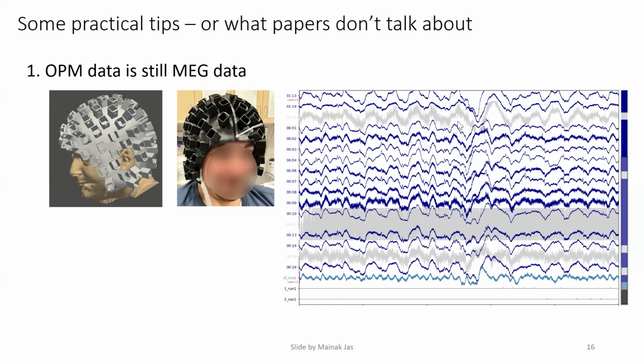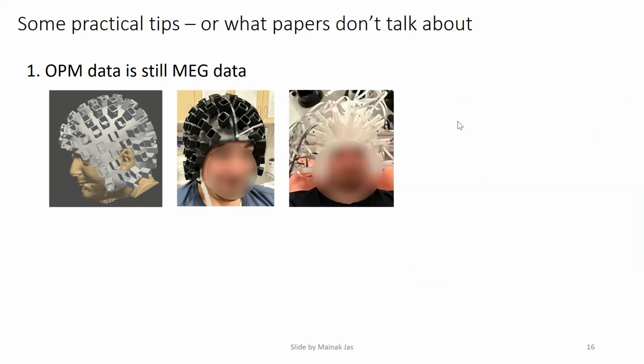And maybe some of you have already caught what the issue is. We had printed a black helmet, which has a pigment which is causing artifacts. And every time the person had a cardiac event, you would see this bump in the signal. And then what we did is we reprinted this helmet, and now we're getting clean data.